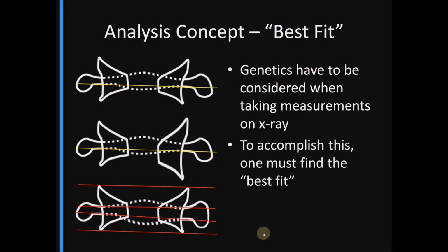Here we have an atlas that is the third atlas in reference to our anatomy, and it has 4 different references. It has a superior and inferior tips, has a superior arch attachment, and those 3 are in agreement when we look at the comparison. But the inferior arch does not agree with the other 3.